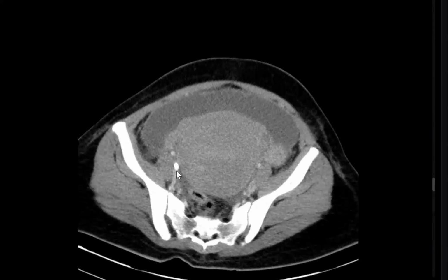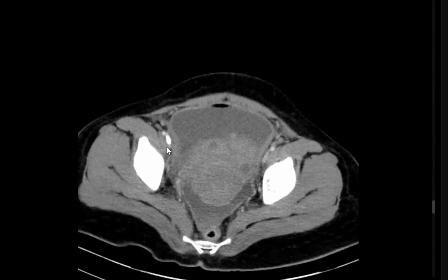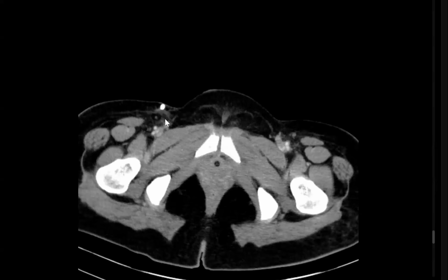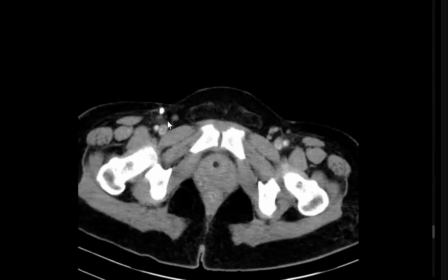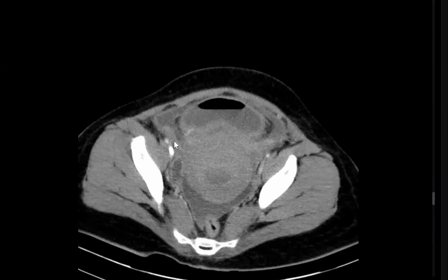Is this study enough, or do you need another study? I can also see that there is an intravenous catheter present on the right side, related to the operation, to assess the condition and inject fluid.